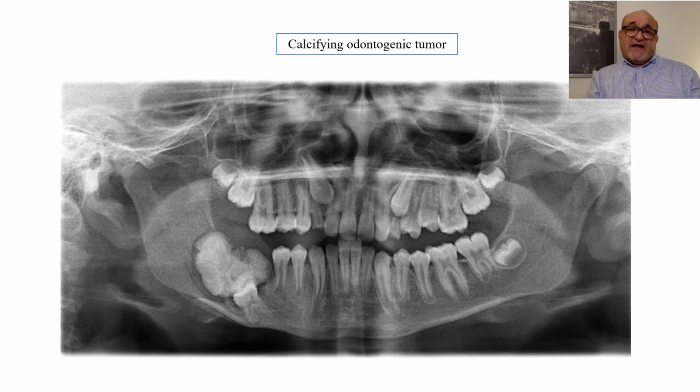Another case of calcifying epithelial odontogenic tumor, you can see it here associated with an impacted lower 7. It has a soft tissue capsule which, as you can see over here, has grown inside the oral cavity. It is typically found on the superior border of the crown of the tooth, and it tends to push the crown of the tooth downwards, as you can see here.